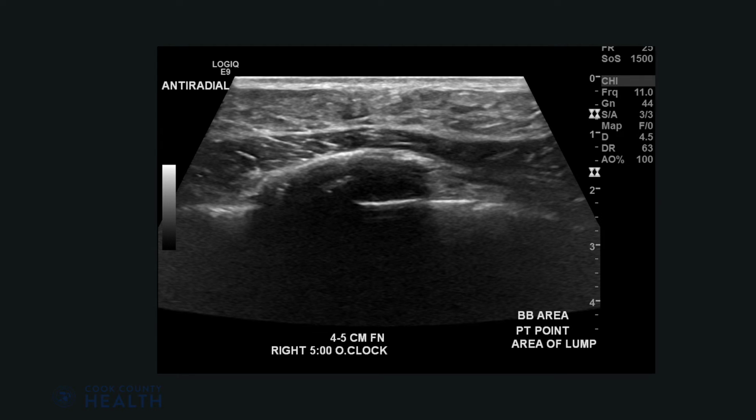This is an ultrasound. There is a heterogeneous echotexture. This patient was on hormonal treatment for more than 5 years. She had come to breast imaging due to a palpable lump. No ultrasonographic evidence of a mass or cystic lesion was identified. This imaging is, again, indistinguishable from a cisgender female, just identifying regular breast tissue.